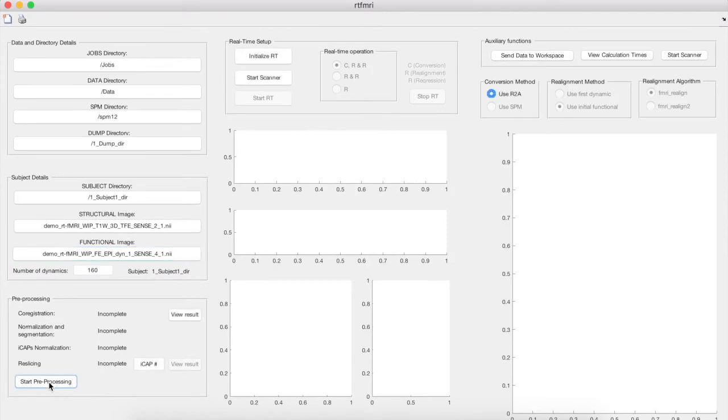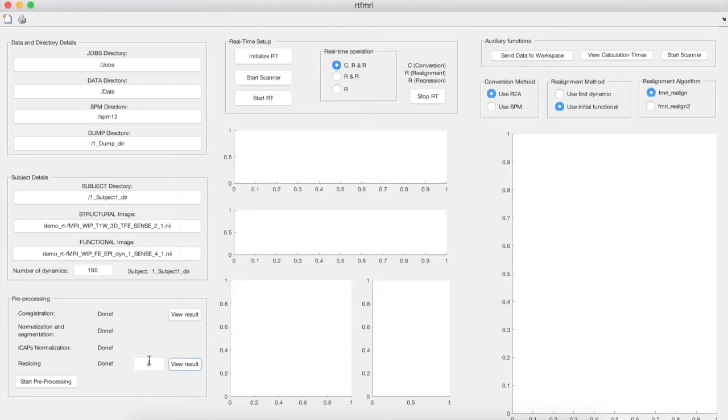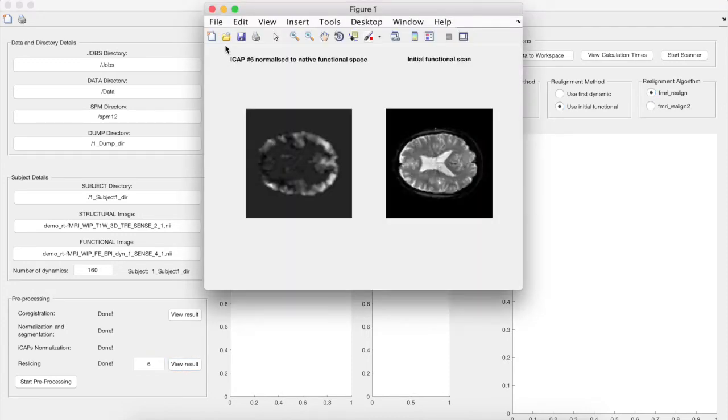Here you can see that being executed, and the process has just been sped up for the purpose of this video. The specific fMRI network model that we use can be viewed in these pictures. We have a set of 20 images that together form the model for our data.